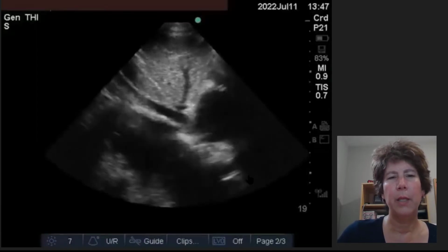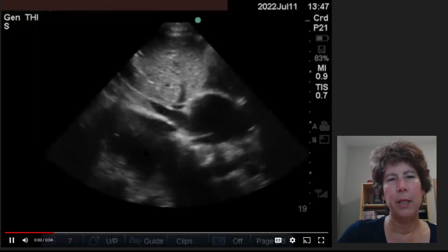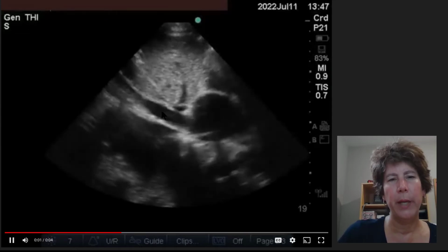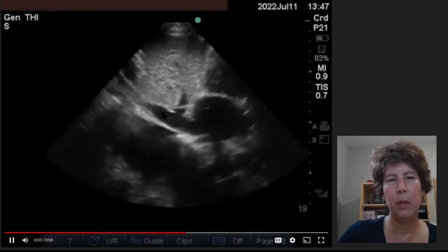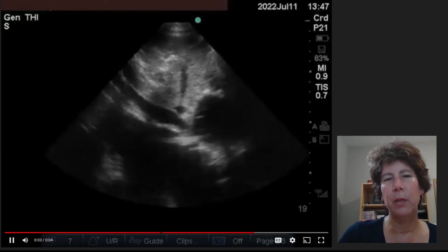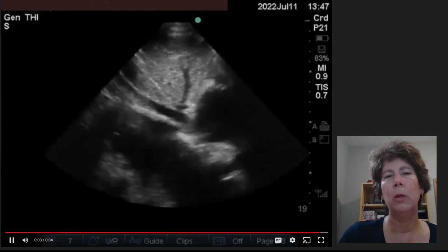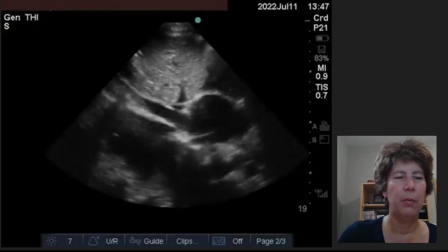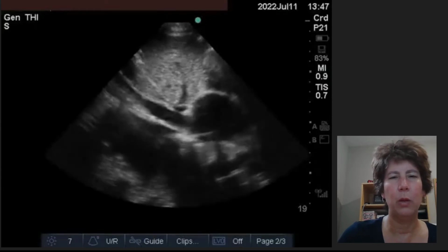So, this was your follow-up scenario where you were post-op in the recovery room with a hypotensive patient, and this was the IVC view that I gave you, and I asked you for your management plan. What this IVC view is showing is, I'd say, at baseline probably fairly dilated. If you think this is 1 centimeter, it's probably coming up to the 2 centimeter mark, but collapsing. So probably a patient that could tolerate increments of fluid, and you all very correctly stated that you would fluid resuscitate, but in smaller boluses than usual, sort of 250 ml increments, and likely repeat the hemoglobin just to make sure that there wasn't more blood loss than we had thought.